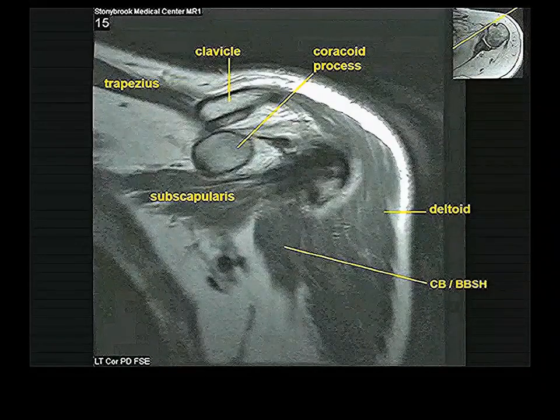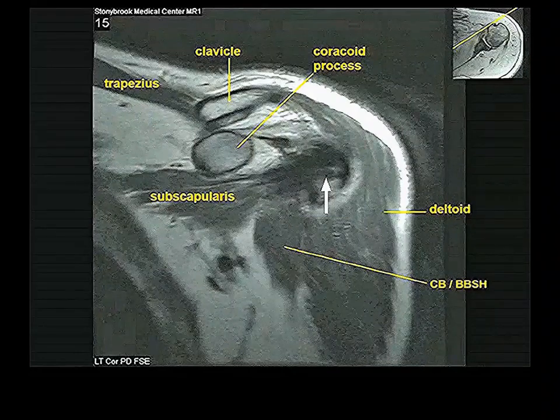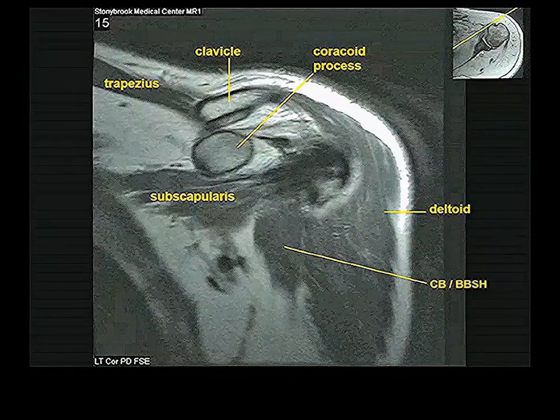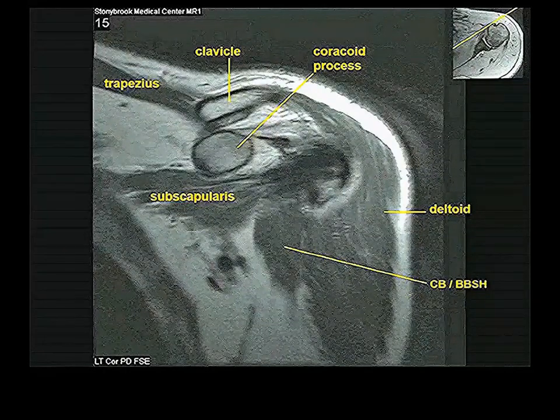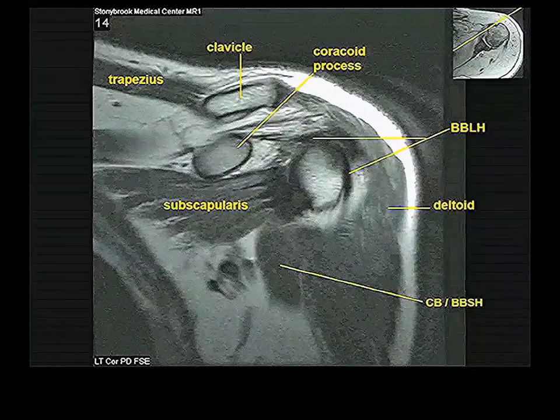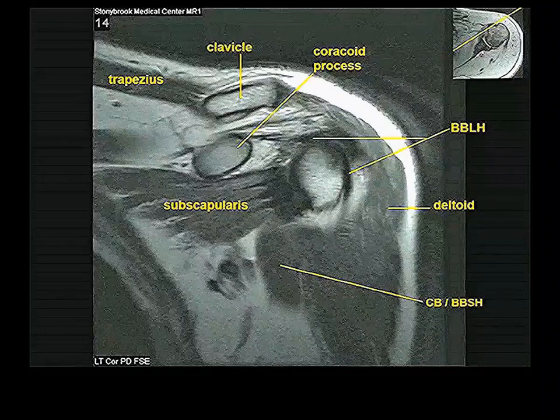And we know the subscapularis tendon inserts onto the lesser tubercle of the humerus. So somewhere here must be the lesser tubercle of the humerus, or I caught it right there actually, lesser tubercle of humerus. We're getting to the base of the coracoid now, where it's going to attach to the blade of the scapula, getting close to it. If this was the lesser tubercle of the humerus, so identified because the subscapularis goes to it, then beyond the lesser tubercle of the humerus comes the intertubercular groove. So now we're looking at the intertubercular groove and the structure that lies in it, which is the tendon of the long head of the biceps brachii.